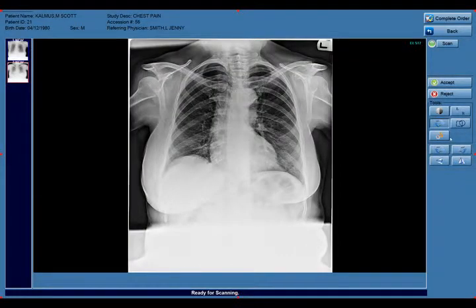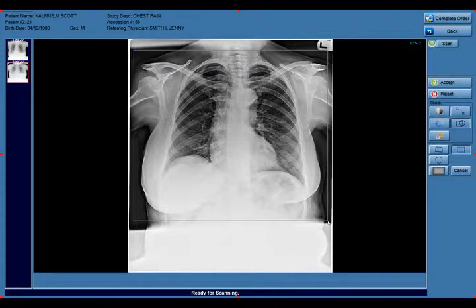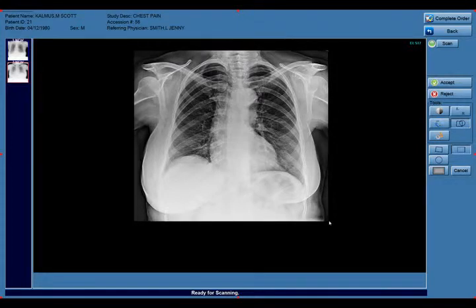We also have something called a mask or a shutter. This will help you collimate out all the white perimeter from collimation by clicking the square, clicking once and dragging completely down, covering your region of interest, and this will now shutter out the collimated area.